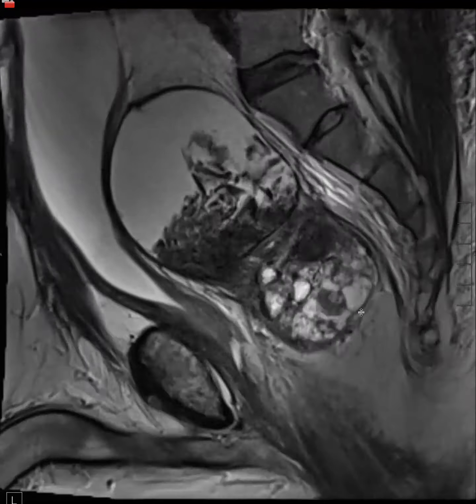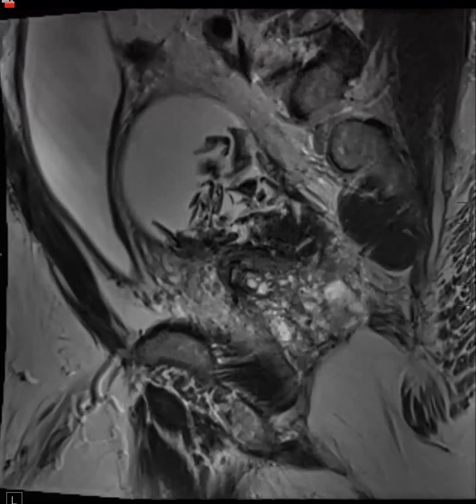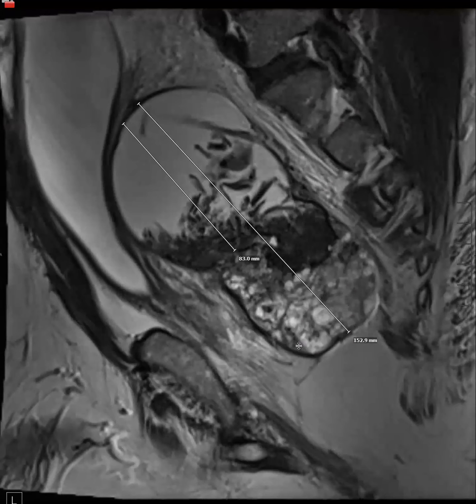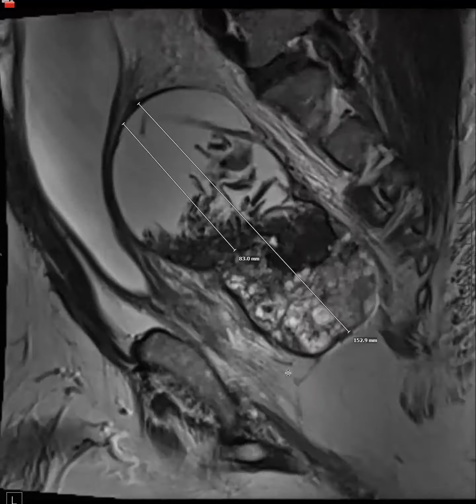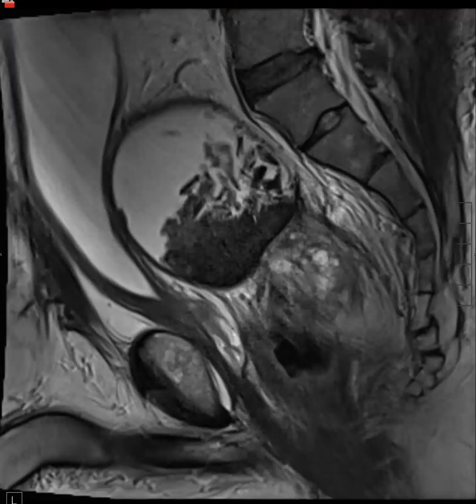I feel like this overlaps with other lesions we've seen. See how it has that multicystic appearance, like the giant adenofibromas of the seminal vesicle or the prostate, and also stump tumors. When I saw this, I thought it was a cystadenoma. But you're right, there's lots of overlap. If we had gotten an MR, I think we would have said, one, probably exophytic from the prostate, and two, probably a benign lesion, although they're going to resect this kind of thing anyway. Very interesting. At this point, MR is so much better.